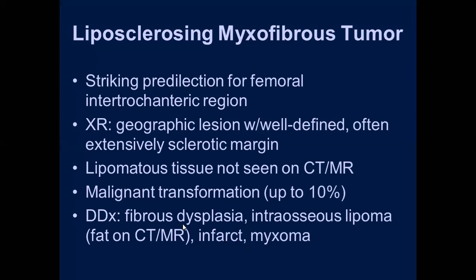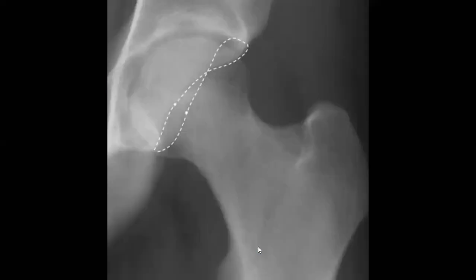Bone infarction, maybe fibrous, maybe lipoma, maybe myxoma. Not common in the exam, but okay. No, very rare to see even, but okay. Okay.